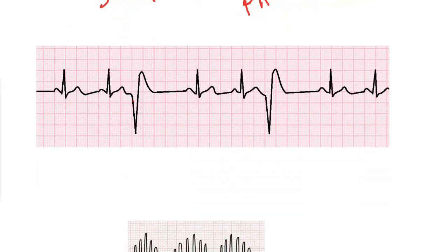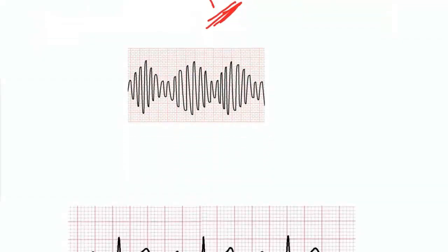Next, we have premature ventricular contraction, okay? And this condition, again, is it benign or not? So if a patient has some sort of cardiac defect, it could be dangerous, but PVC is seen in normal, healthy individuals, and it could present as a fluttering or a skipped heartbeat.